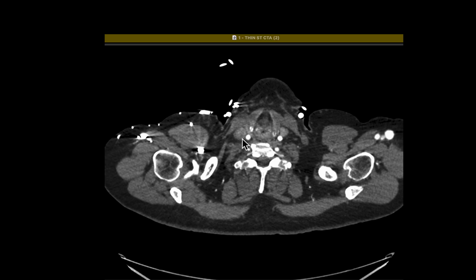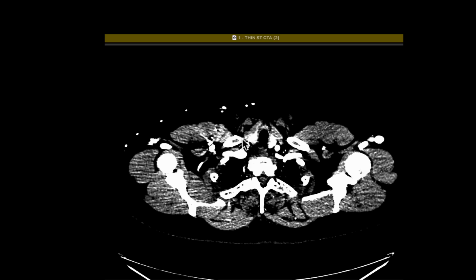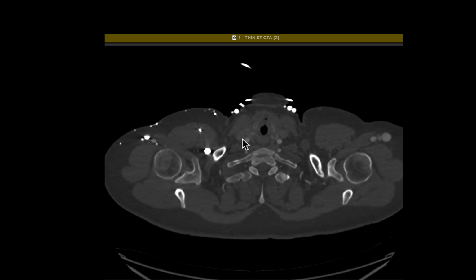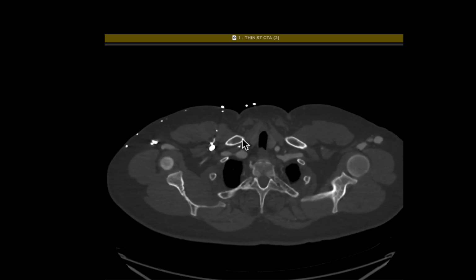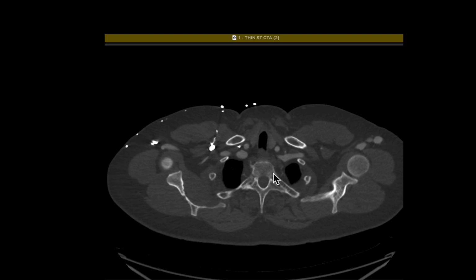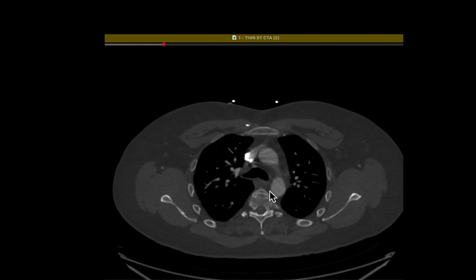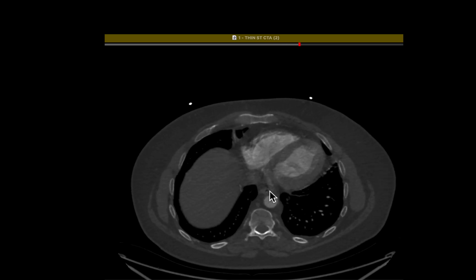Patient had a CT scan for this shortness of breath, and the only real interesting findings on this scan are at the spine. And so if we go down the spine, we will see that there's fusion of the rib articulations with the transverse processes as well as at the head of the ribs. And in particular, notice you can see at this level it's completely fused. And this continues down for quite a bit. So this is consistent with the ankylosing spondylitis.